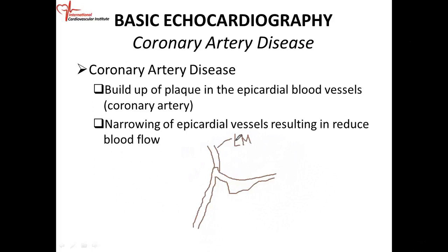Okay, the left main coronary artery. And then this would be the left anterior descending coronary artery. And then this is the left circumflex.